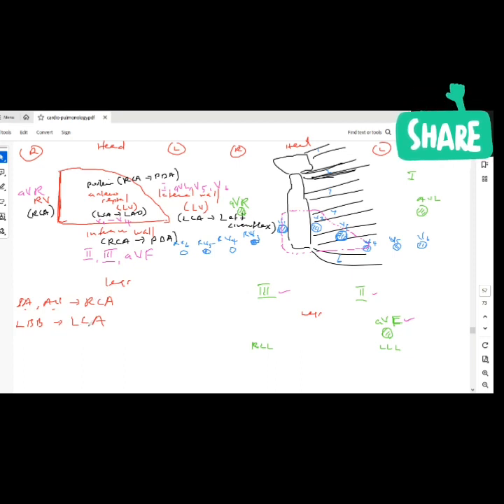In a patient with left coronary artery infarction, you might see evidence of left bundle branch block on ECG, because it's also supplied by the left coronary artery. So you might see a widened QRS complex. These are just some additional clues that might tell you which artery is involved. Okay.